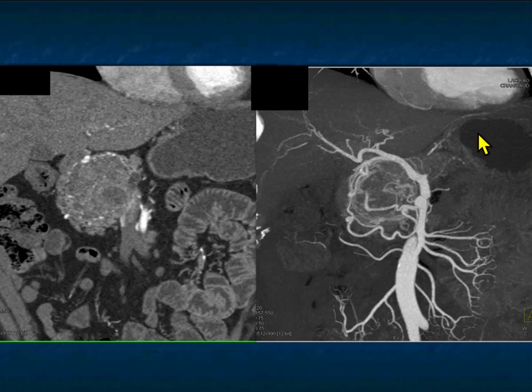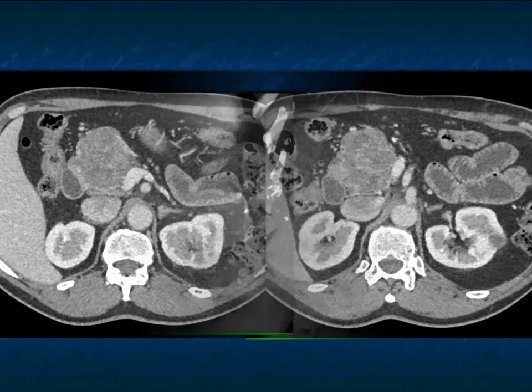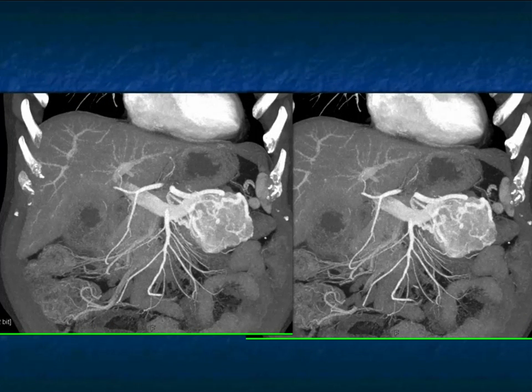Here's that circumvascular sign of the patient's GDA and part of the hepatic artery. And again, here it is as you go to venous phase imaging. A large lesion. The differential would include a serous cystadenoma. I would not say a pseudocyst, I would not say an IPMN. It's not a great location for an MCN, but it could be. It doesn't have the typical look you would see with a SPEN tumor. So again, very nice example.